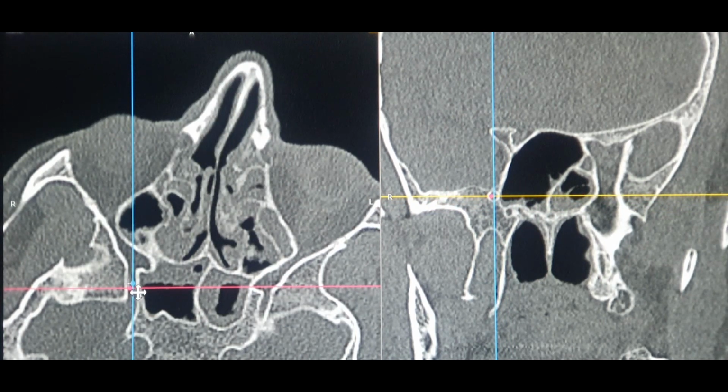This is the foramen rotundum from which the maxillary nerve comes, eventually enters into the posterior pterygopalatine fossa, and from there it comes out as the infraorbital nerve on the cheekbone, through the infraorbital foramen. So that is how you can locate everything on the axial scan.